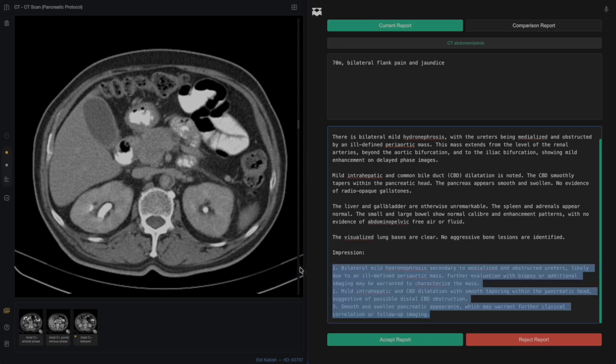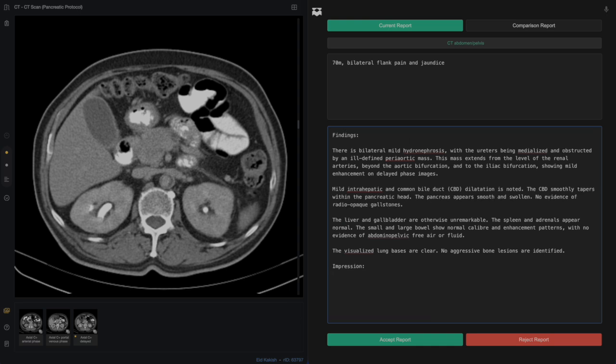Yeah, so it's made a bit of an impression there, but now we've learned a little bit from our interaction with RadChat. We could probably write something a little bit more succinct. Overall appearances for systemic IgG4 related disease with associated retroperitoneal fibrosis and autoimmune pancreatitis.